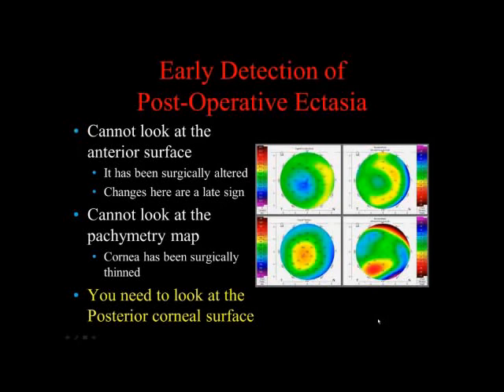This is a more advanced case. You'll notice here, this is an ablation. So again, you can't tell whether this is normal or not because the anterior surface has been ablated, but you should not have changes on the posterior surface.